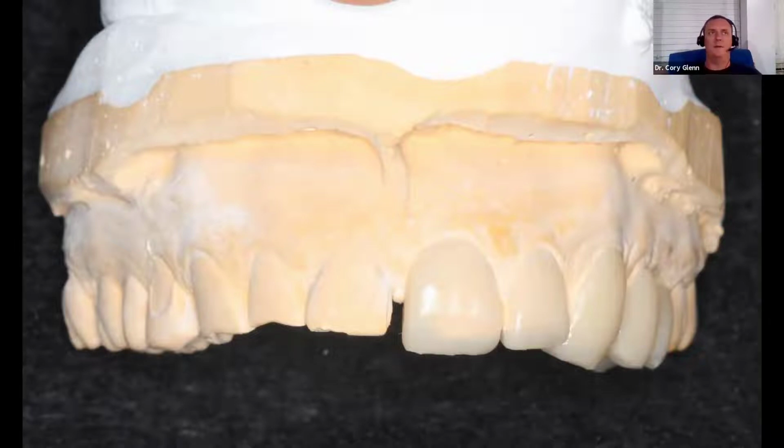But one of the keys I found to doing full mouth rehab efficiently was to basically do the rehab in composite first, because then all the stress is off. Now, if everything's to full contour and you've solved the aesthetic problems, now you can just do single tooth dentistry, you know, do a couple of crowns this week, get them back to deliver those and prep another couple. You're just doing single tooth dentistry because the bite's stable and all that.